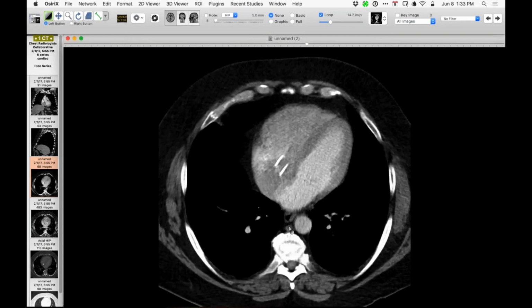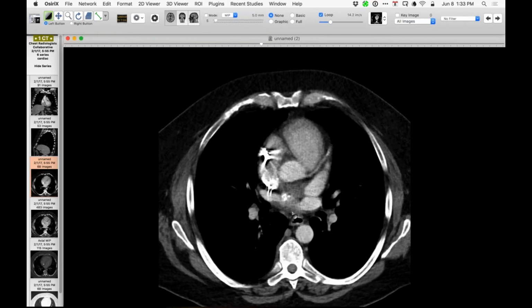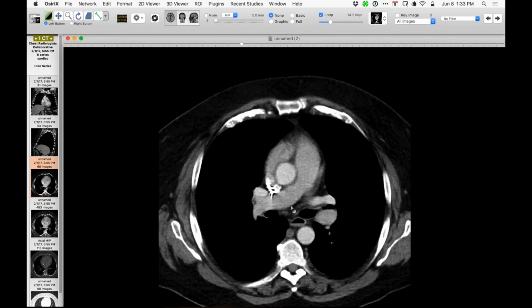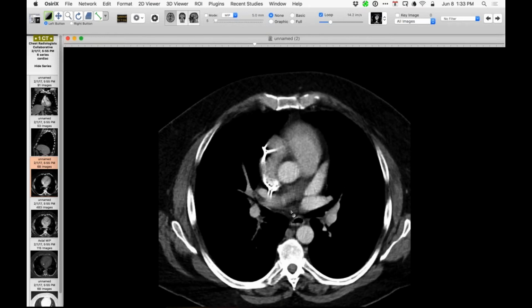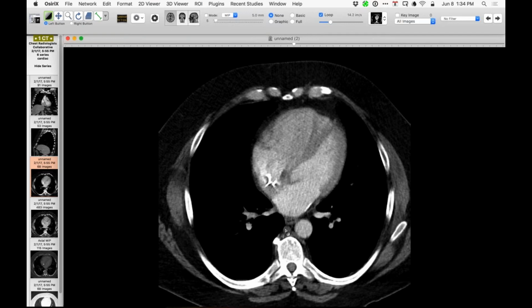Yeah, because both of the sites are near pulmonary vein ostia. What about the upper pulmonary veins? Did they get it too? There's a little calcium anteriorly on the right. If we scroll down, that right superior pulmonary vein was kind of the roof of the left atrium, right in there. Oh yeah, right there. And then there. Left inferior.